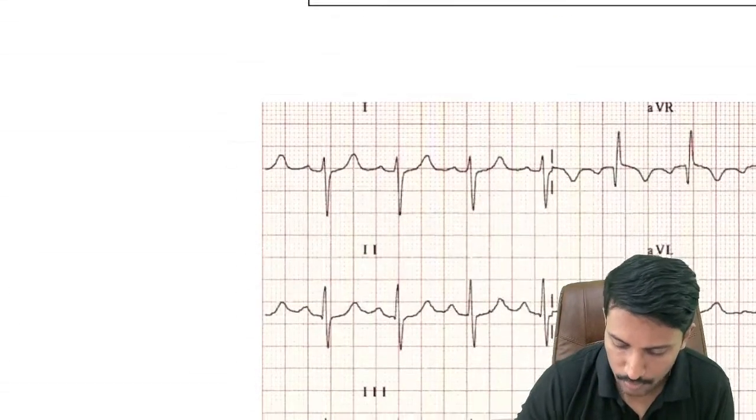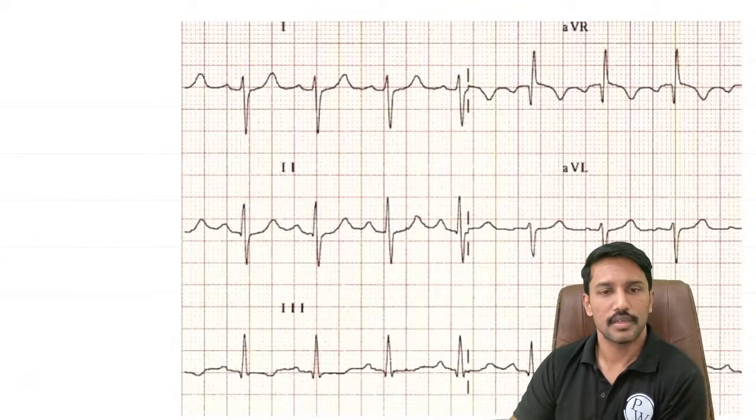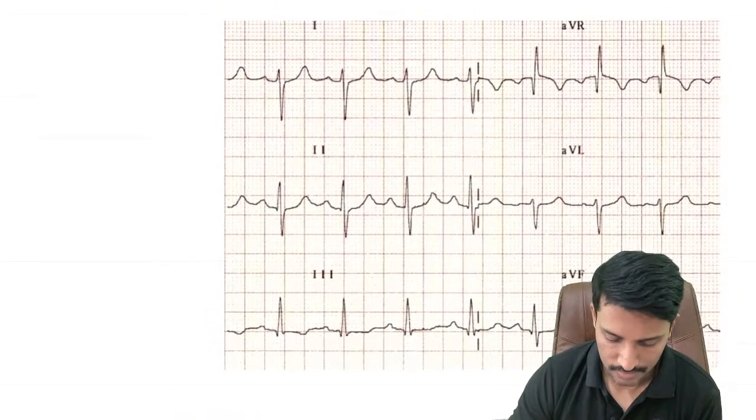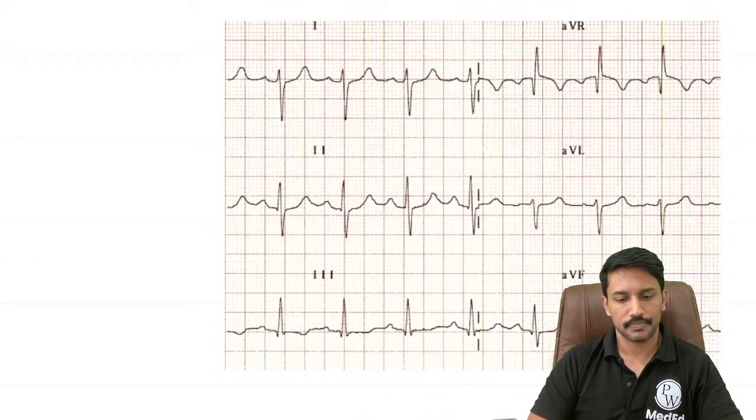We will look at one more example. Okay, this is a very clear ECG image. Tell me which lead is isophasic. Which lead appears to be isophasic?